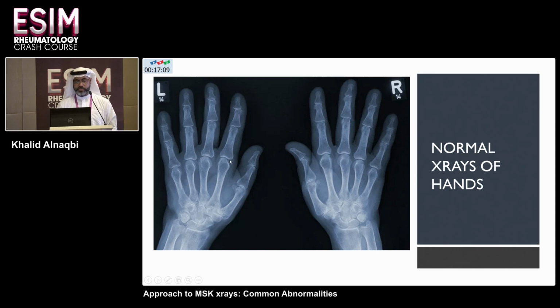So here you can see a beautiful black line in the carpal joints, in the radio-ulnar joints, the distal one. You can go up front and say, or distally, to talk about the metacarpophalangeal joints, MCPs. And then you talk about proximal interphalangeal and distal interphalangeal. Each of those joints in our rheumatology mind is associated with certain diseases.